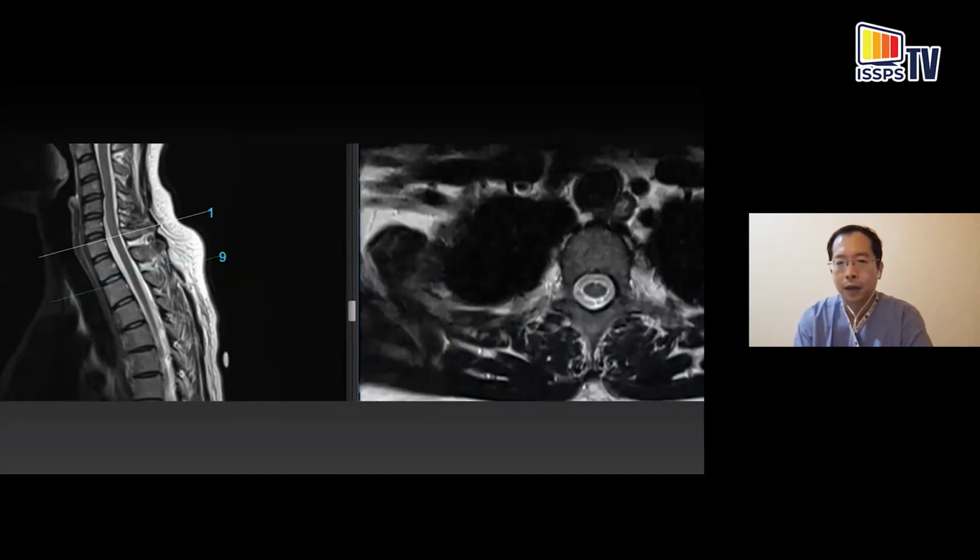And as you come down again, the lamina falls off, as we showed you previously, and you are looking now at the inferior-most tip of the transverse process, and look at this big space here. This is fat-containing tissue. But beyond that, this is only a few millimeters deep, and beyond that is the black space of the lungs. And this is where we don't want to go beyond.